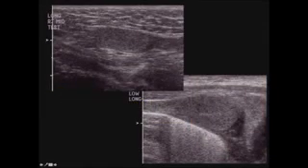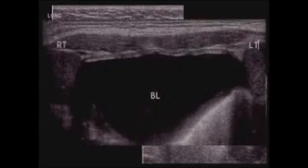So what does it look like? Here you'll see there's a hypoechoic testicular appearance within the inguinal canal surrounded by fat. This one is actually up near the internal inguinal ring. You can see adjacent loops of bowel. And in this particular image, you can see here are two testes that are along the internal inguinal ring just within the pelvis, here on the right, the bladder, and then here on the left.